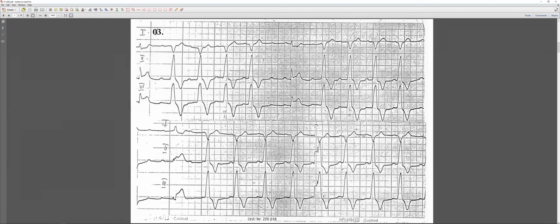Next, you can see the PP interval in front of the middle one. If you shift it to the left, you do see some P waves inside the QRS complex. You see it when the ST starts, on the shoulder, a little notch.